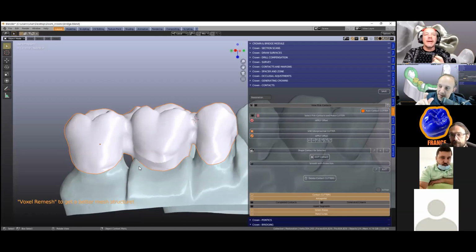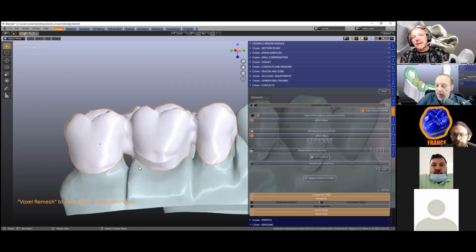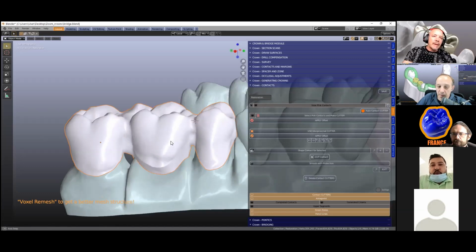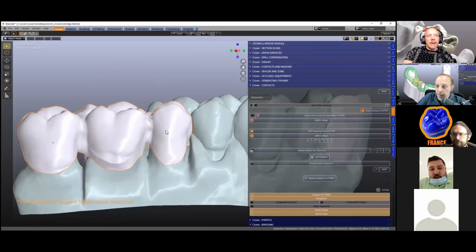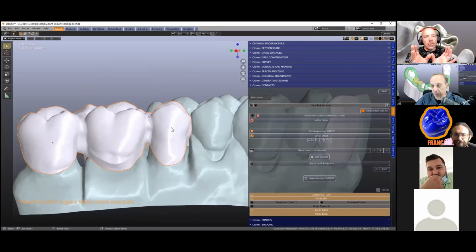And then scale it. Good idea, if you can scale it. A different type of measurement for the micro brush. I love it. Actually, could you connect it only at the very contact point itself? Let's imagine there are two crowns, and we have contact between the teeth, just there to be welded. So you've got two crowns. Yeah, you can do it. If you've got two adjacent crowns, you can fuse them together. Is that what you mean? Yes, and imagine this one is the pontic, but nevertheless, it's the same idea, I guess. Yeah.